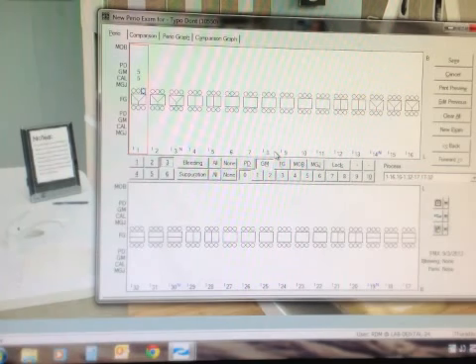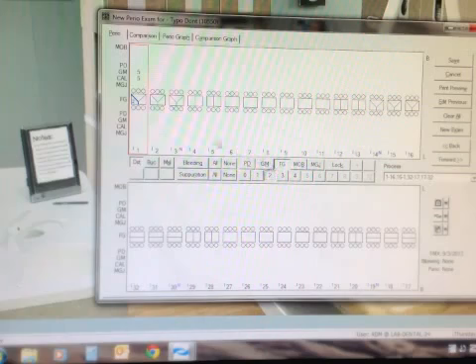After charting the gingival margin, you are able to then move on to the furcation involvement. Click the FG button. After clicking the FG button, you are able to select where the furcation is on the tooth. For example, tooth number 1 presents with a distal furcation that is a class 2. So I go down below the FG button and click the number 2. After that, it will chart the number 2 in the distal portion of that tooth.